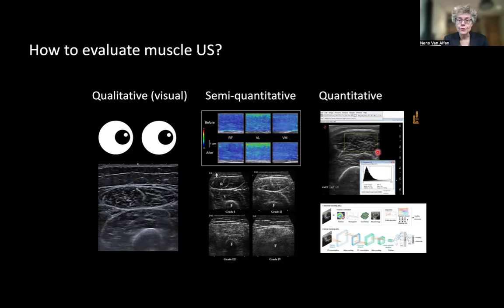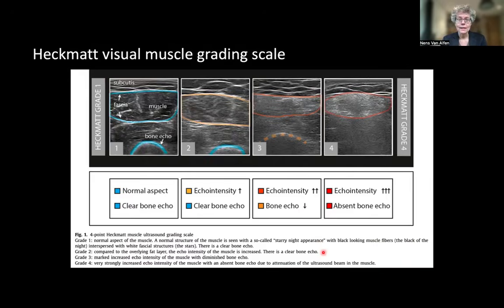It's a region of interest, and you have an image software create a histogram for black to white pixels and then show the average pixel value for it. This is beyond the topic of this talk, but this is the most, well, scientific way, if you wish. It does need reference values for your system, though. And this is the future, I guess. This is the AI version where you take a radiomics package and have that assess a muscle, but it needs to be trained. And therefore, we need a lot of data across centers.